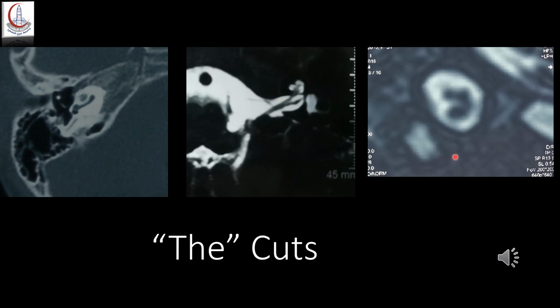The third cut is the parasagittal cut at the level of the internal auditory meatus, which gives me the idea about the 4-nerve configuration of this patient. So looking at these 3 cuts, we have a primary idea about the bony landmarks, our surgical access, about the normality of the cochlea, and about the normality of the cochlear nerve.